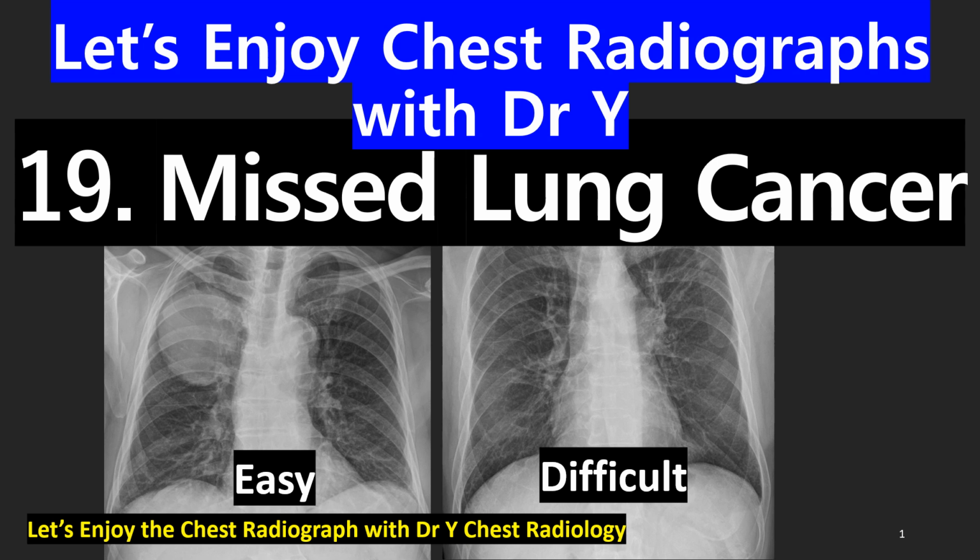Today's session is 19 about missed lung cancer. On the left side chest radiograph, it is easy to find the lung cancer. How about the right side image? It's not easy to find the lung cancer.